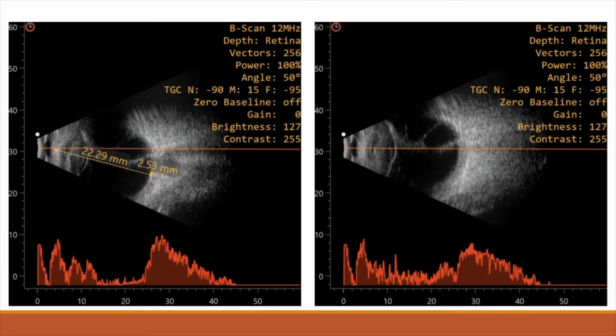So this is an ultrasound scan. The first scan is an axial scan showing lens echo. Vitreous shows low reflective dot echoes, and in the other scan we can see that there is a medium reflective membranous echo with a fine membrane bisecting that. This first dome-shaped echo is suggestive of choroidal detachment, and the fine membranous echo bisecting that is suggestive of vortex vein.